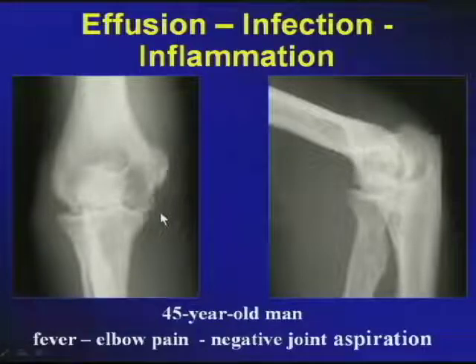If you look at the frontal radiograph and the lateral radiograph, you immediately appreciate the surrounding soft tissue swelling, but also note that the radiolucencies underneath the articulating surface represent subchondral changes or permeative erosive changes. And again, try to remember the history of fever. In addition, if you are astute enough, you would also appreciate that there is some narrowing of the joint space.